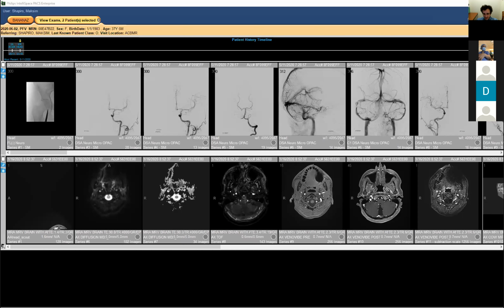The straight appearance of it, though, makes me think that it might be different than the usual meningeal veins over the tentorium. I don't know. It's a curious question. Maybe we need to look into the anatomy books and find an answer for that. So, yeah, I guess we could. I guess it's a question of what it comes to definition, right?